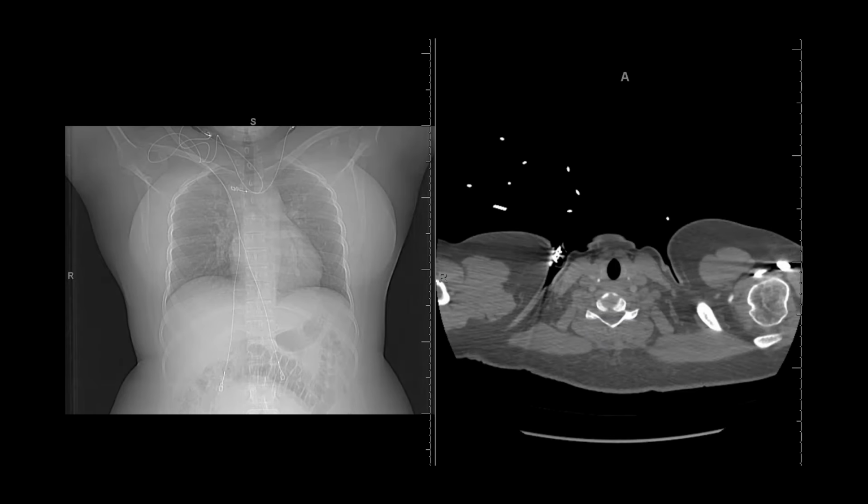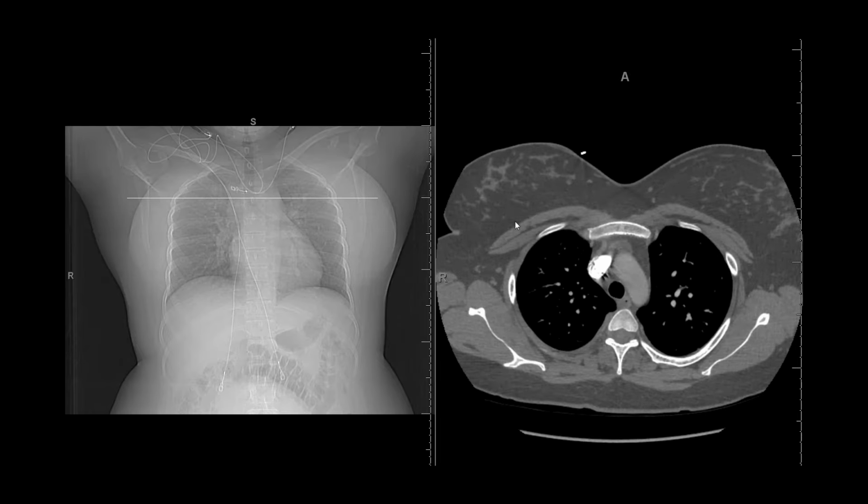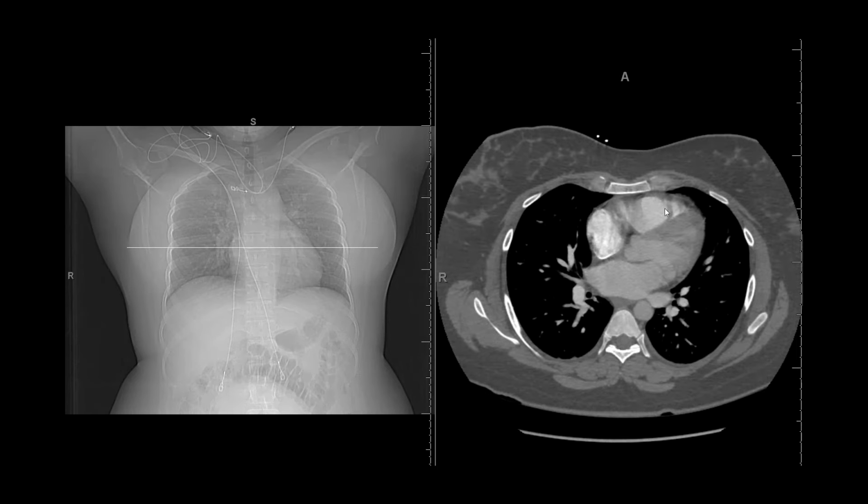As you will see in these review videos, I will use axial images, scout images, and both coronal and sagittal reformats. And as I scroll on the axial images, when I think it's appropriate, I'll have a reference image, in this case a scout image of the patient with a localizer bar showing you at what level we're investigating.